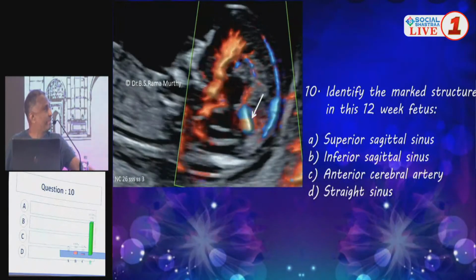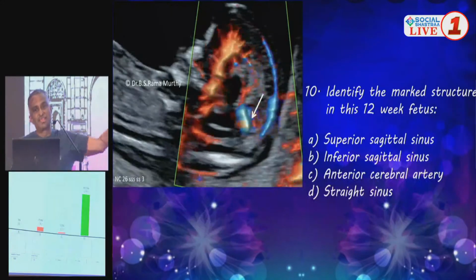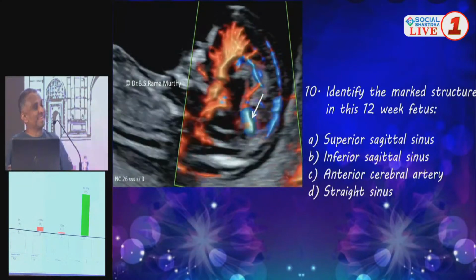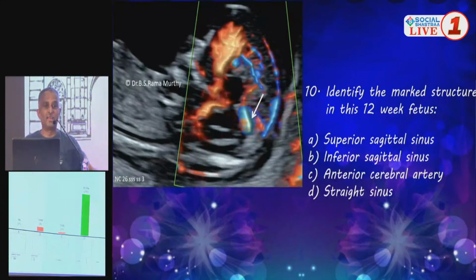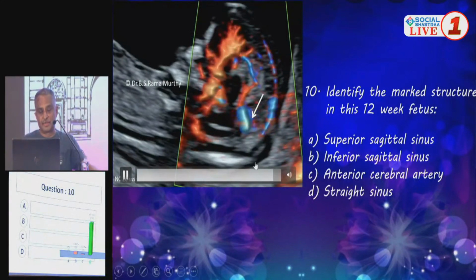Yep, expected. This is perhaps the best performance. This is really heartening. 90% have got it right, and this was, I thought, simple for a radiology crowd, isn't it? Right? So you have the superior sagittal sinus here.